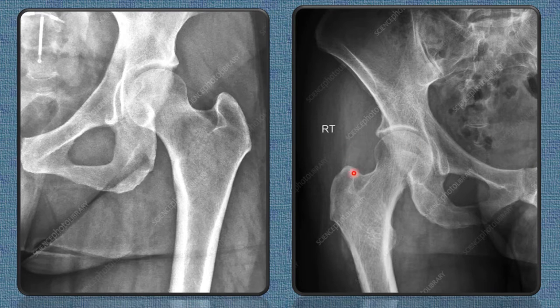Again, you can see clearly this is the trochanteric fossa, greater trochanter, lesser trochanter, head of the femur, right? Acetabulum, head of the femur, neck of the femur, proximal end of the femur, shaft of the femur, superior pubic ramus, inferior pubic ramus, ramus of ischium, ischial tuberosity, body of ischium, body of ilium, iliopectineal line, pubic symphysis, right? Sacroiliac joint. That's it.